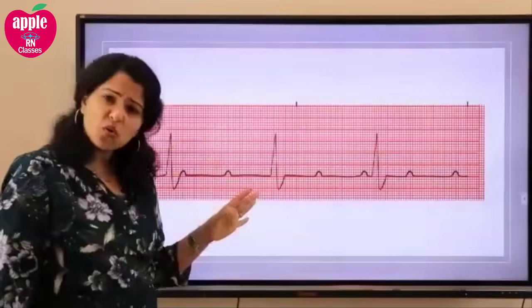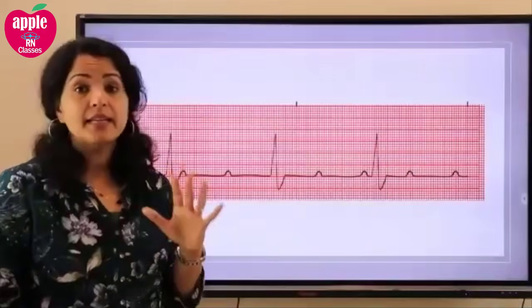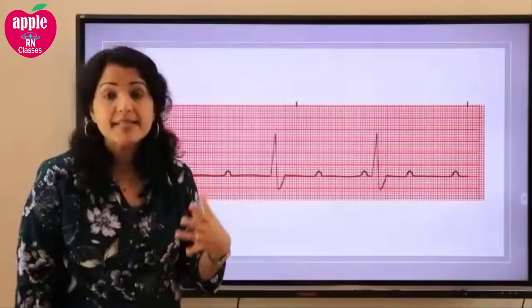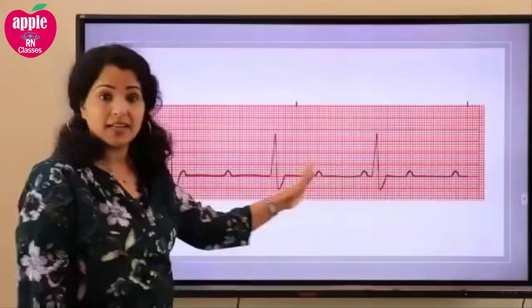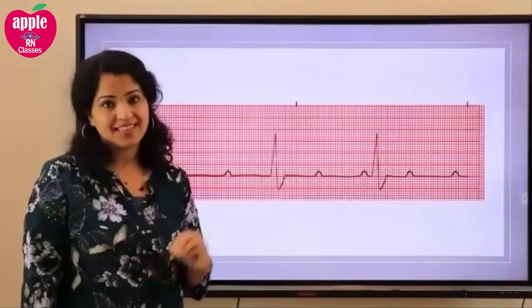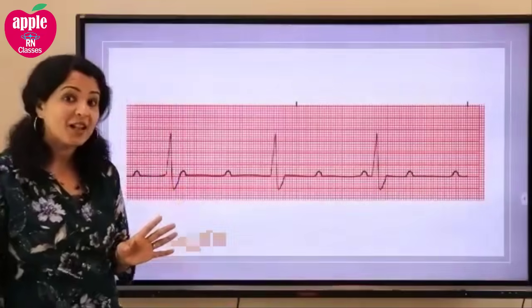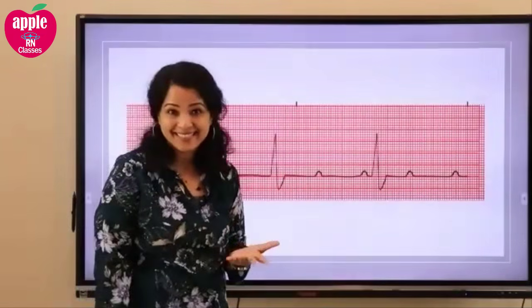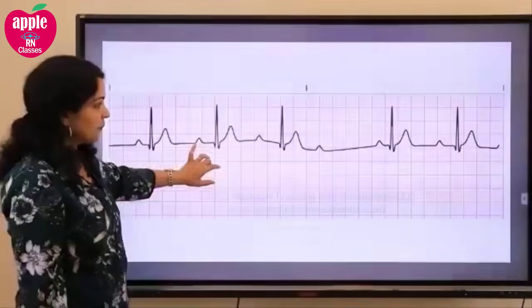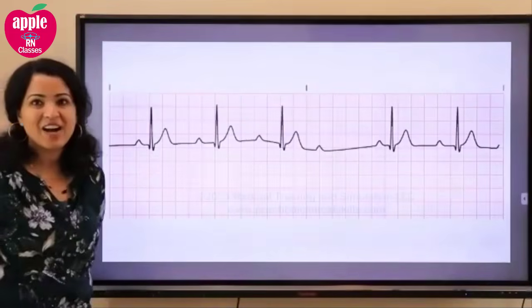And almost all the time, the third degree heart block is going to show you really symptomatic bradycardia. You can look at that, that's bradycardia, and they will have symptoms. Symptomatic bradycardia, and that's going to help you a lot to understand that. All right. So that's the third degree. Now let's do some more. How about this one? How about this one?